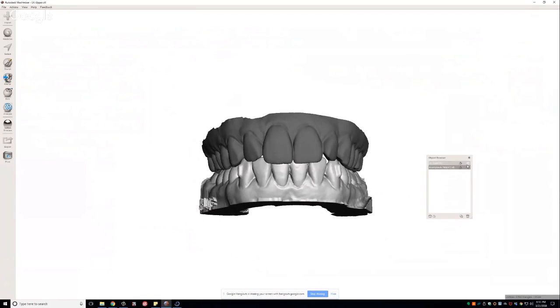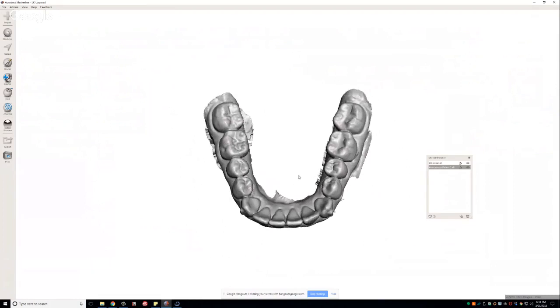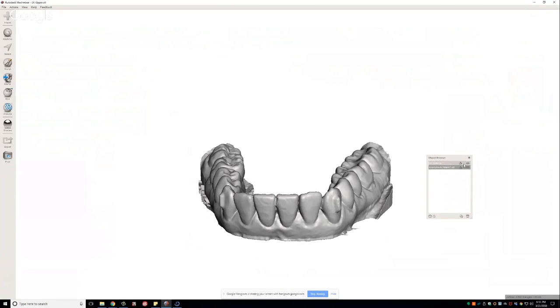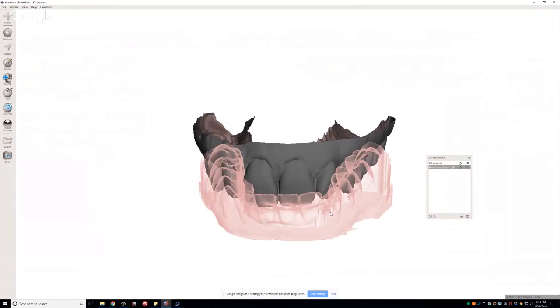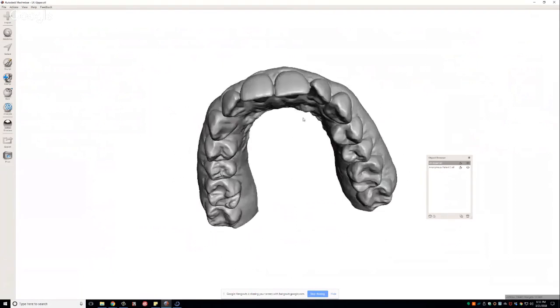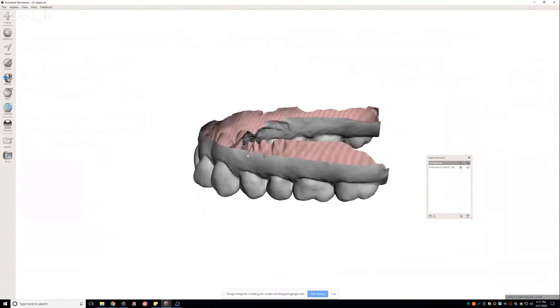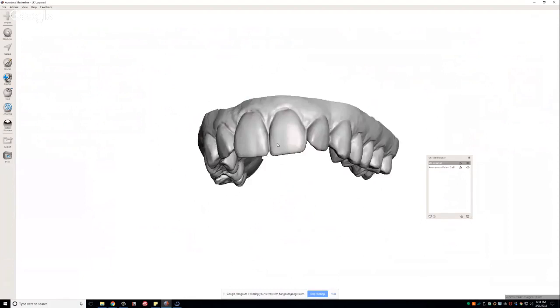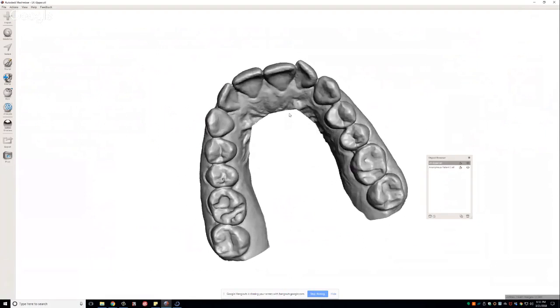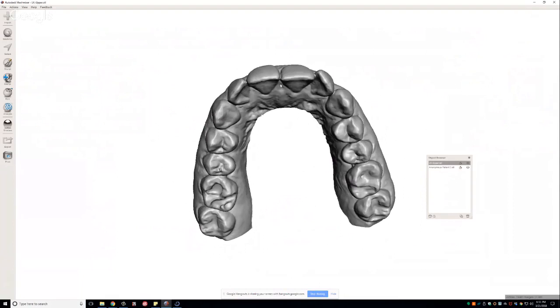We've already aligned her lower teeth. She had very little alignment necessary, just a little bit of relapse on her lower anterior. So the upper was really her main interest. She didn't like the crowding in the lower, but she really doesn't like the tooth that sticks out, the number 10, or upper left lateral incisor. What she also doesn't necessarily realize, to my eye, is that it's more an issue of the central incisors that are tucked back.